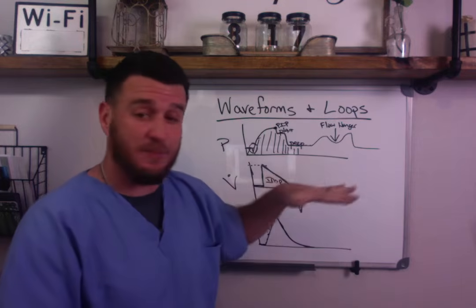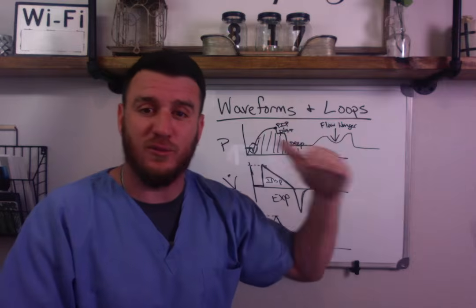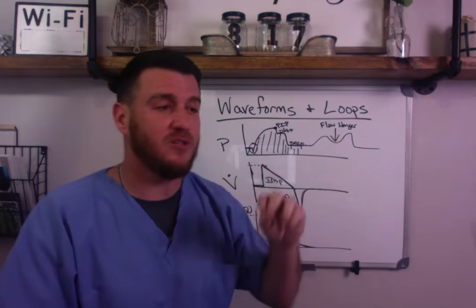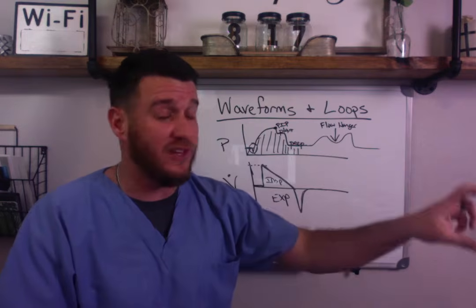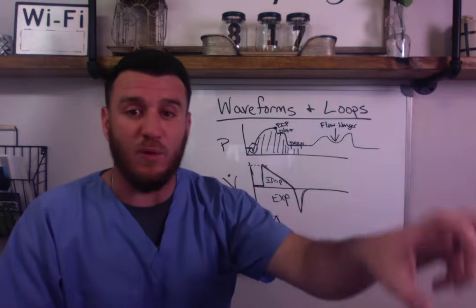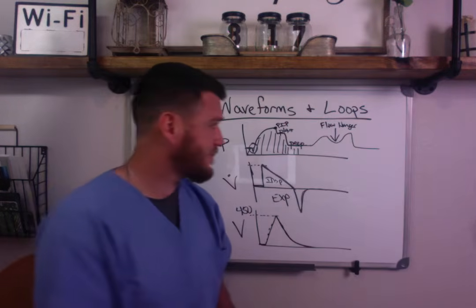And what happened with this patient for us is that their rate went from 35 down to 24. Why? Because we were satisfying their need to breathe. We were making the ventilator breathe like what they were asking for. And that's the key to all of this, okay?